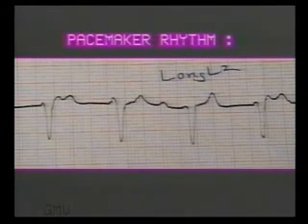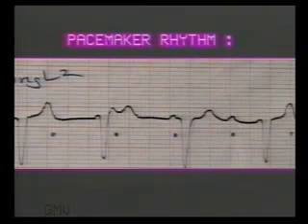Note the wide QRS complexes occurring very regularly at a rate of 75 per minute. This is a pacemaker rhythm. Since the pacemaker is placed in ventricles, the QRS complex is wide like ventricular beat. Now note the P waves. P waves are seen at regular intervals and bear no relation to the pacemaker rhythm. The condition is complete heart block on pacemaker. We will be studying the heart blocks in the next chapter.